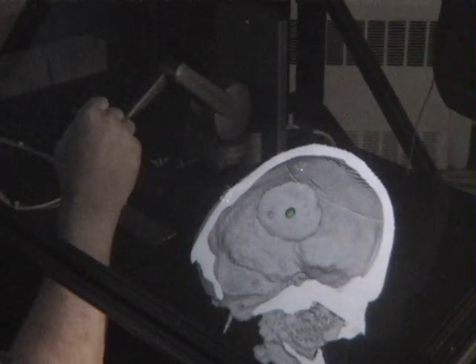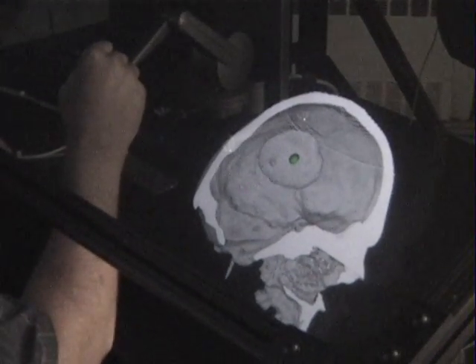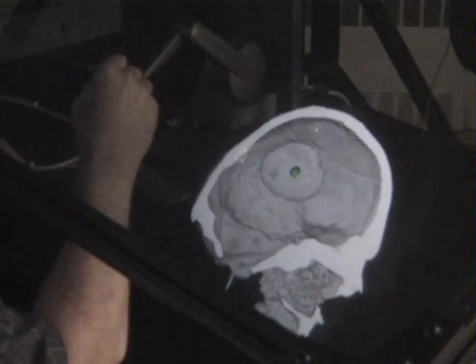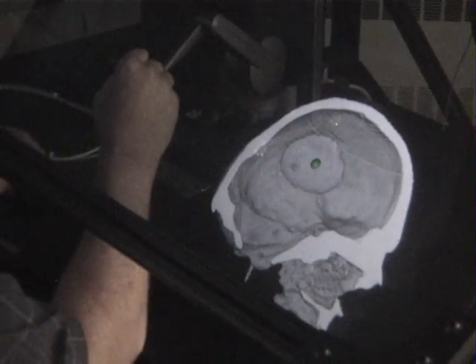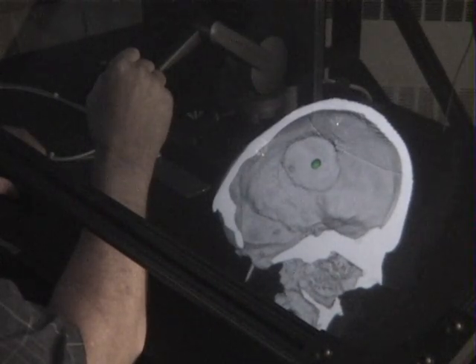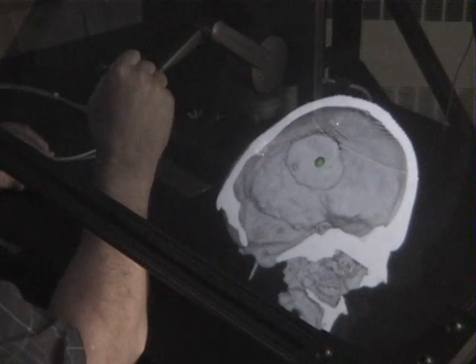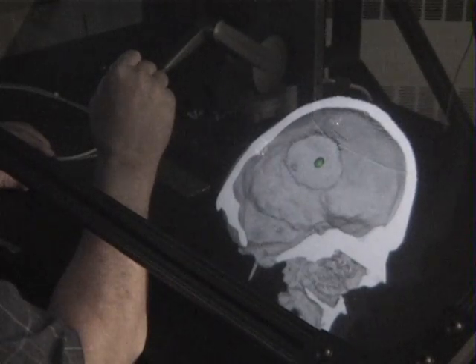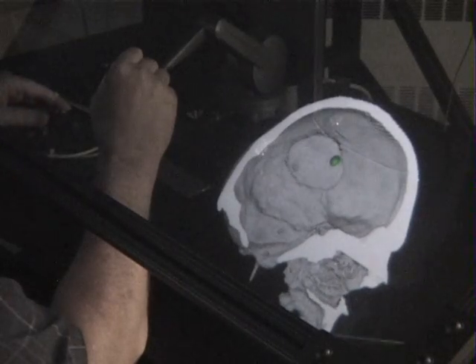So what I do is I try to hold the tool as perpendicular to the surface of the implant as I can, because I want to push it out in a straight line, and just apply a little pressure and push, and you probably saw the implant move. It takes a few moments for the calculations to occur. And when we get some movement on the tool, we'll know that we can take a look at the results. Here we go.